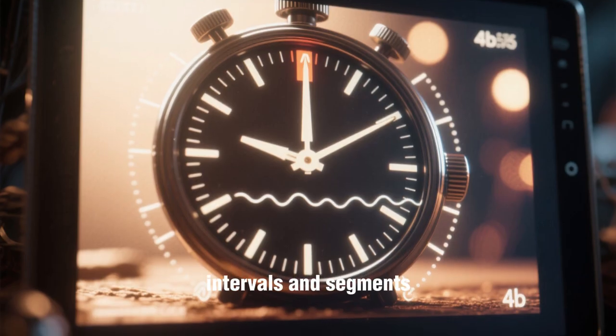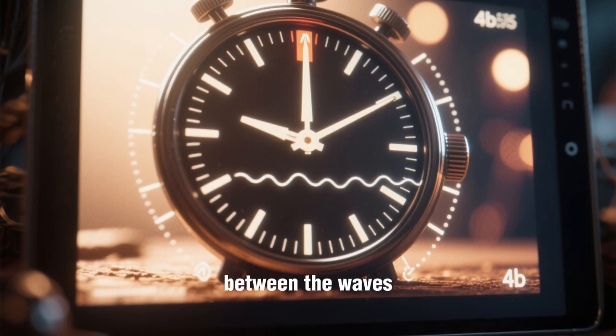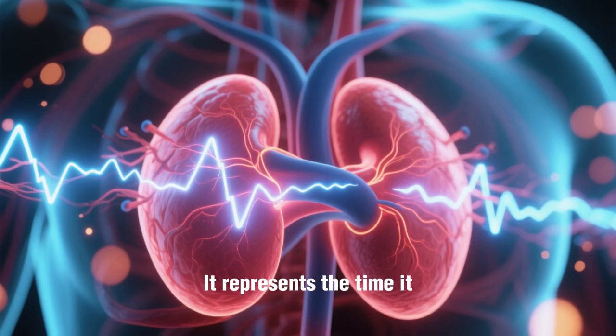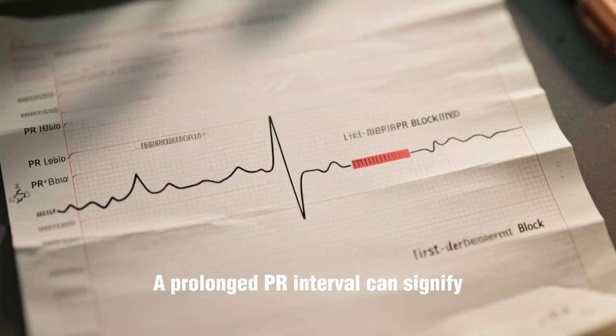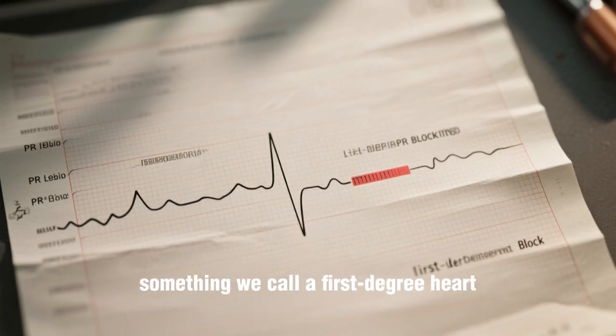Now, let's talk about intervals and segments. These are the measurements of time between the waves. The PR interval is measured from the beginning of the P wave to the beginning of the QRS complex. It represents the time it takes for the electrical signal to travel from the atria to the ventricles. A prolonged PR interval can signify a delay in this conduction, something we call a first-degree heart block.